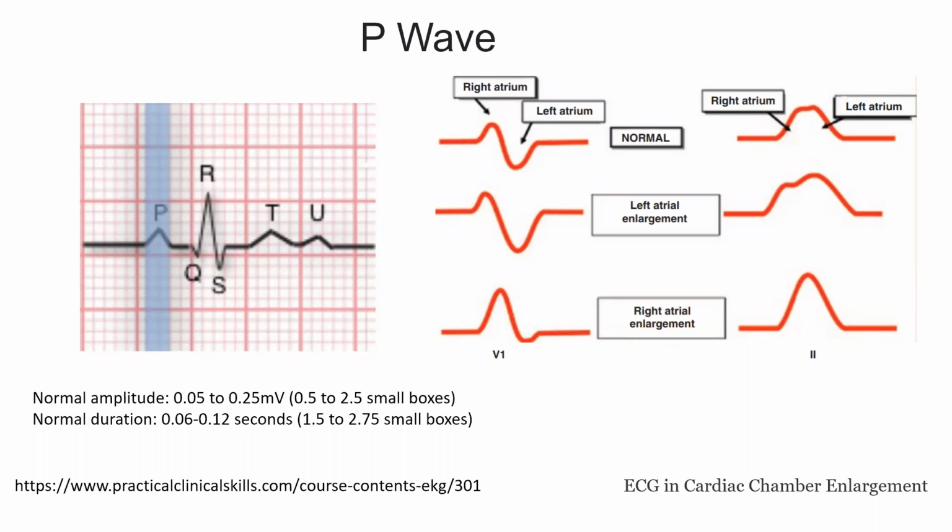Hello everyone, this is Dr. Cui. In this video, I would like to continue the discussion of the EKG. Here's the second part. The next step is to analyze the P wave.